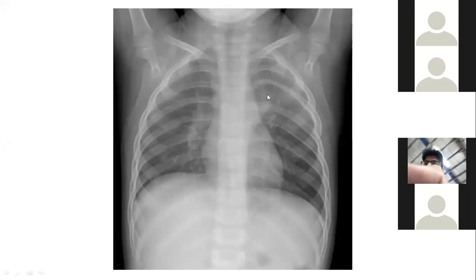Now, is it mediastinal or pulmonary? Yeah, you have got the answer already. That's correct. If you trace it carefully, actually the lesion's margins are extending much beyond. Okay. So again, it is silhouetting the paraspinal line here, and this is a posterior mediastinal mass, and definitely there is thinning of this particular rib, possibly due to erosions, and widened intercostal space posteriorly on the left side.